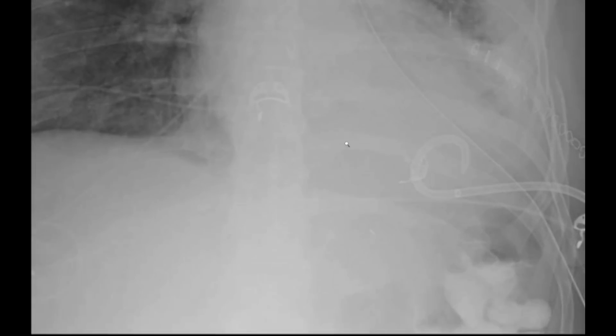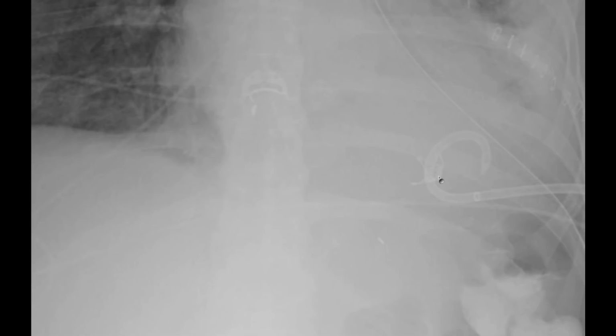So I'll mag that up. And I definitely didn't recognize this. It's easy to go by. It's partially obscured by the catheter, and it's the kind of thing where you think maybe you don't know what that is, or just go by it entirely because it's on the skin or something. But this is a thing right there.